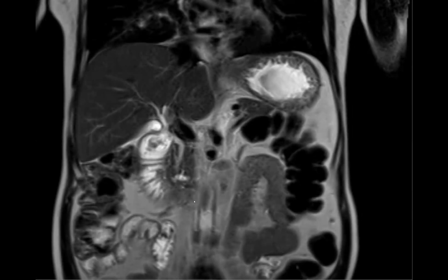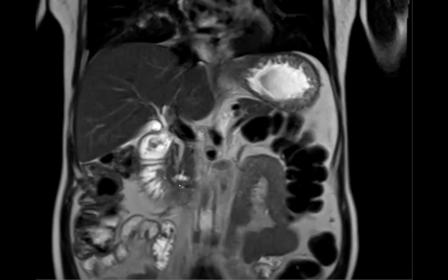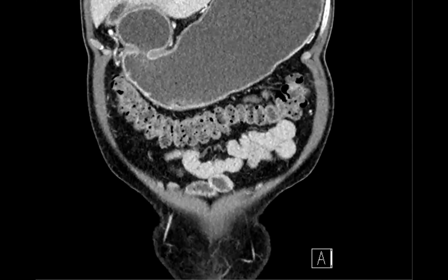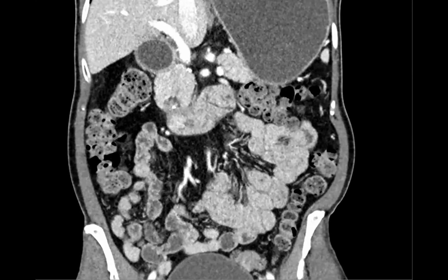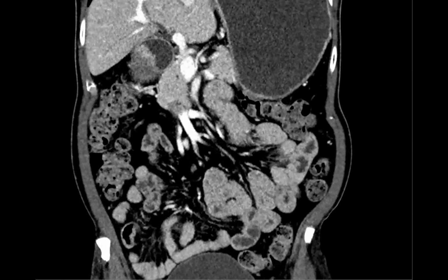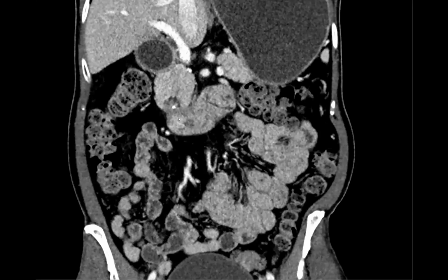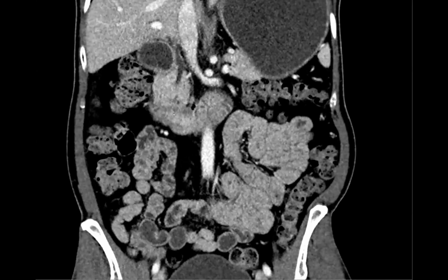So basically, there's obstruction of the. There's that tube. There's like a soft tissue thingy. Right. Exactly. Right here, there's infiltrating soft tissue. Yeah, the malignant obstruction. Go back to the CT. I think we could look at this gastric outlet obstruction. And then there's this abrupt caliber change right here. So is it a primary duodenal cancer that's invading the pancreas, or is it extra pancreatic? Nowadays they talk about malignant potential of serous, like, is it a serous cystadenocarcinoma?